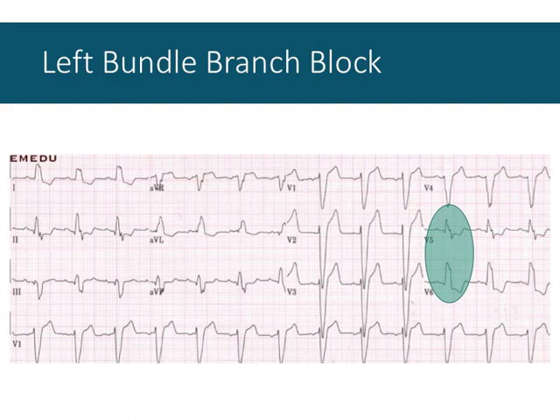V5 and V6 showing that characteristic notch. It's not obvious. There is a notch. It's not as nice as the cartoon that I drew on the last slide. But it's obviously there. There is some delay. Maybe this is just a less severe bundle branch block. But a much larger negative deflection in V1 and certainly in V2, as the last thing that you see is the electrical signal traveling away from you in the lateral wall.